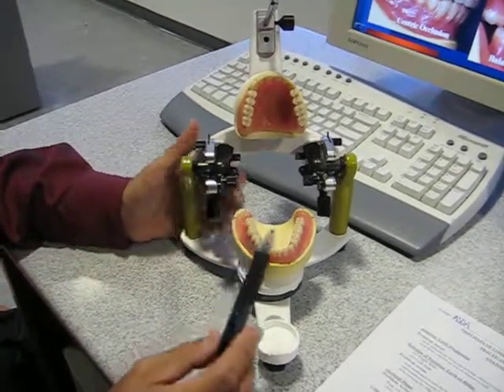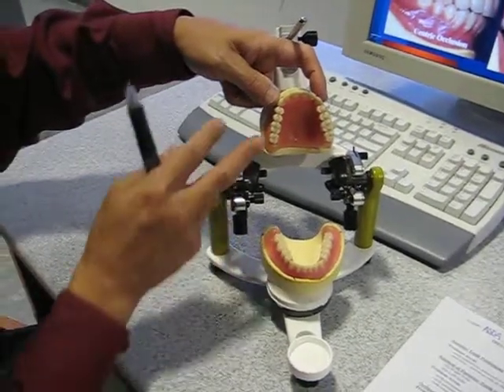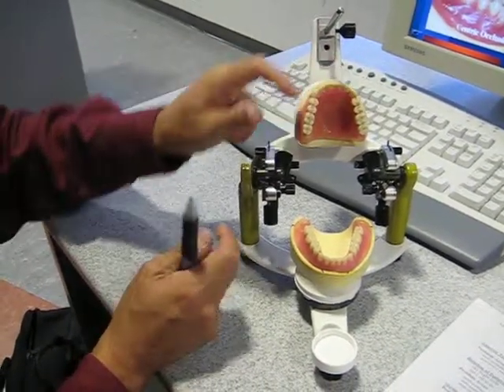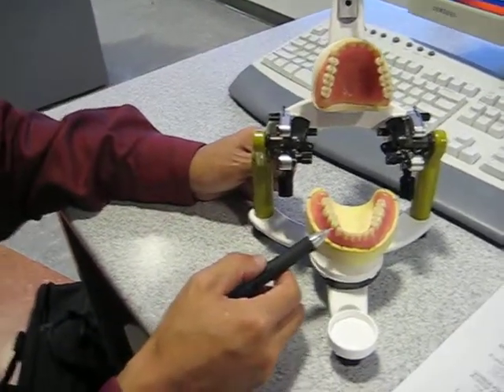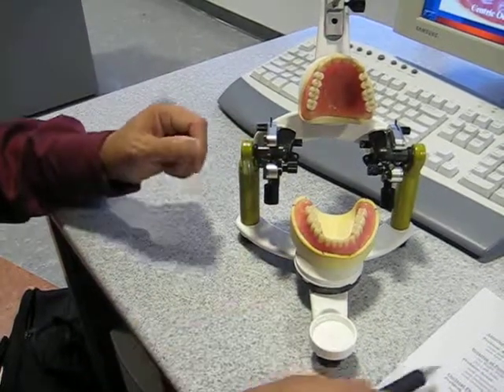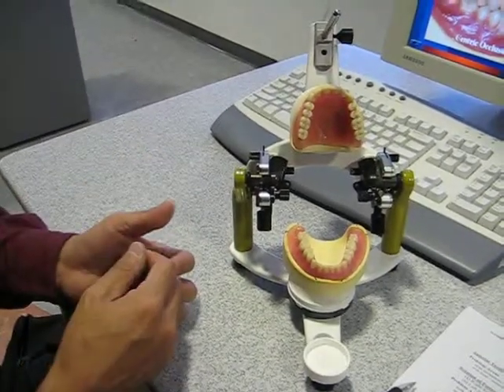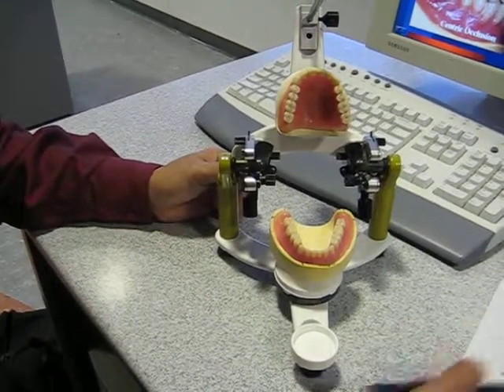Another thing that can happen when the arch form is a little bit wide anteriorly is that we tend to start the posterior teeth more anteriorly the wider the arch goes. And the more anterior we are, the more potential there is to, again, be off the ridge in the mandibular premolar region, as well as perhaps not having enough room to set the teeth in terms of the excursive positions, okay, to avoid cusp interferences. So that's one thing, in terms of the arch form being a little bit wide here.